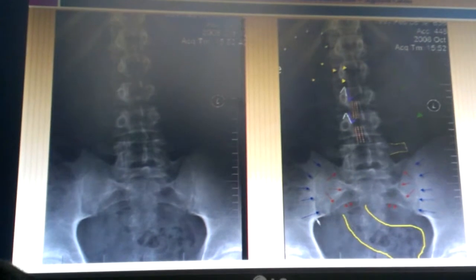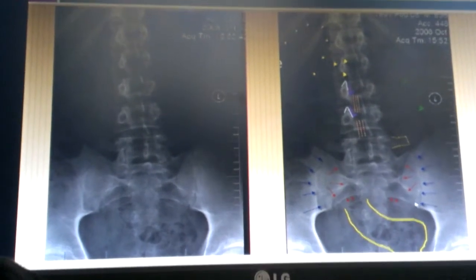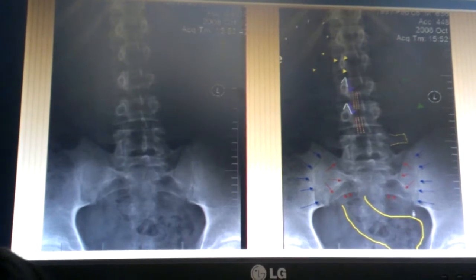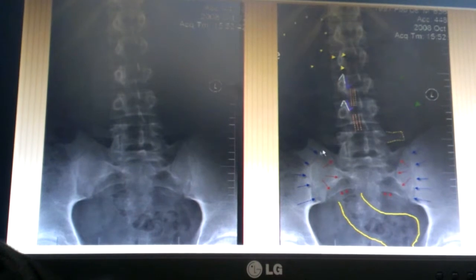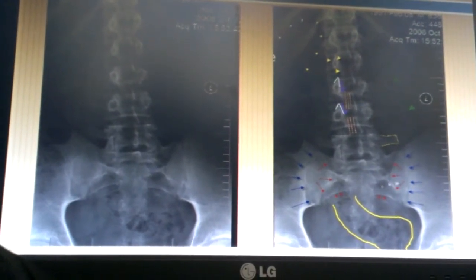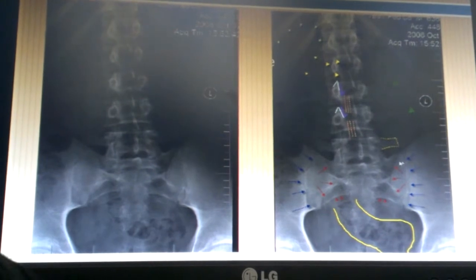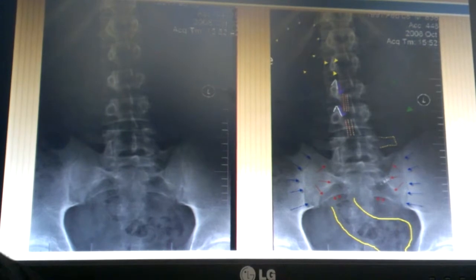So here's the anterior SI joint. We come off of the ala and we come down. If you want to find the posterior SI joint, come up from the bottom of the sacrum, or its apex, and it's in here, and it's in here. More horizontally oriented. We know that the upper 1/3 of our anterior SI is primarily ligamentous, right? So that's why with certain arthropathies, you'll see this becoming ankylosed very easily. DISH does that, and so does ankylosing spondylitis.